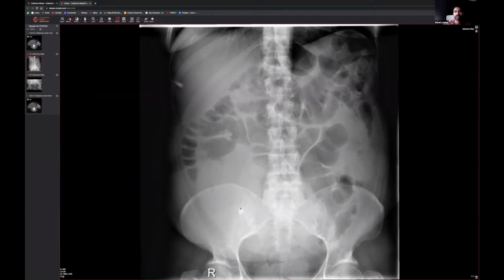But renal calculi tend to be in line with the ureter, which, yeah, you could say it could be, but it's not usually so clumpy and circular. This is very, very circular in appearance, whereas renal calculi don't tend to be as big as this. And if they are, they're normally kind of thin and cylindrical, not so clumpy like this.